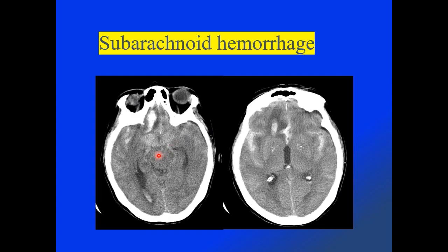This is a different patient who presents with a subarachnoid hemorrhage who then fell and hit her head. And so the patient also has some parenchymal hemorrhages in the anterior inferior frontal lobe on the right side with surrounding edema, with fairly extensive subarachnoid hemorrhages within the interhemispheric fissure and Sylvian fissures, along with small intraventricular hemorrhage within the right occipital horn.